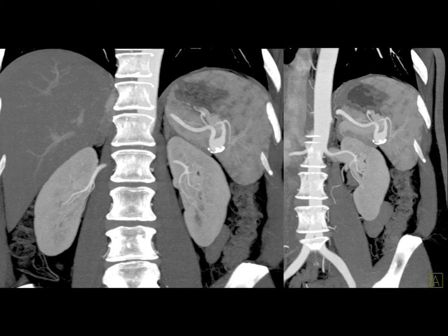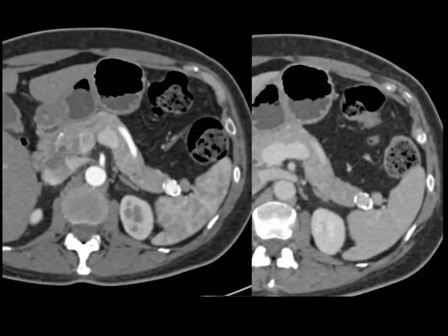This was resected, but the patient did not have a pancreatic neuroendocrine tumor. So you can see, and here's the images again, early and late, there's often overlap. We talk about the challenge of splenic lesions simulating pancreatic lesions. Here's an example of that. It's a splenic artery aneurysm simulating a pancreatic neuroendocrine tumor.